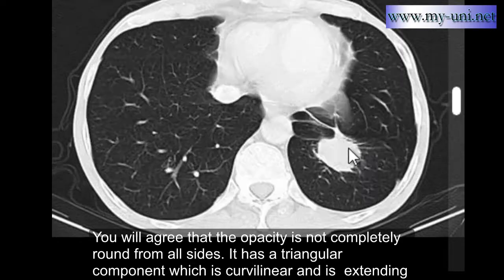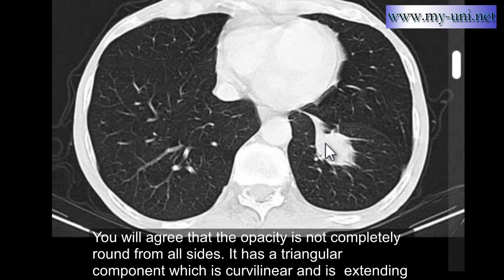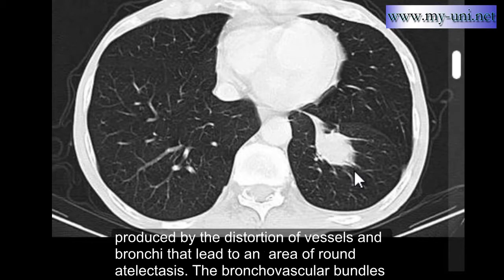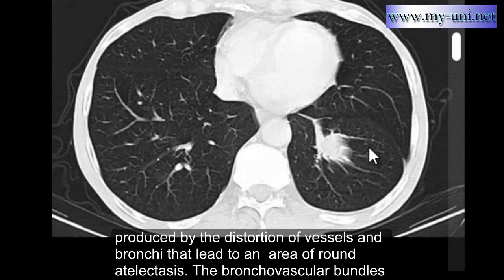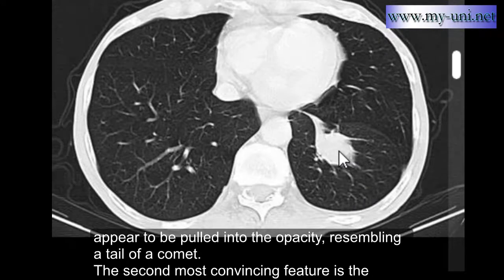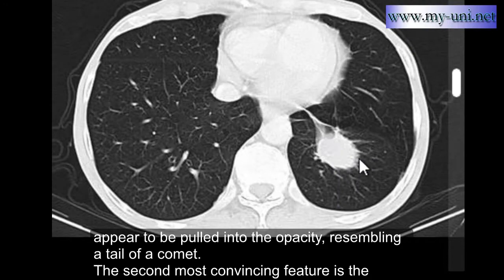It has a triangular component which is curvilinear and is extending towards the hilum. This is commonly known as a comet tail sign, a very common finding in rounded atelectasis. The comet tail sign is produced by the distortion of vessels and bronchi that lead to an area of round atelectasis. The bronchovascular bundles appear to be pulled into the opacity, resembling a tail of a comet.